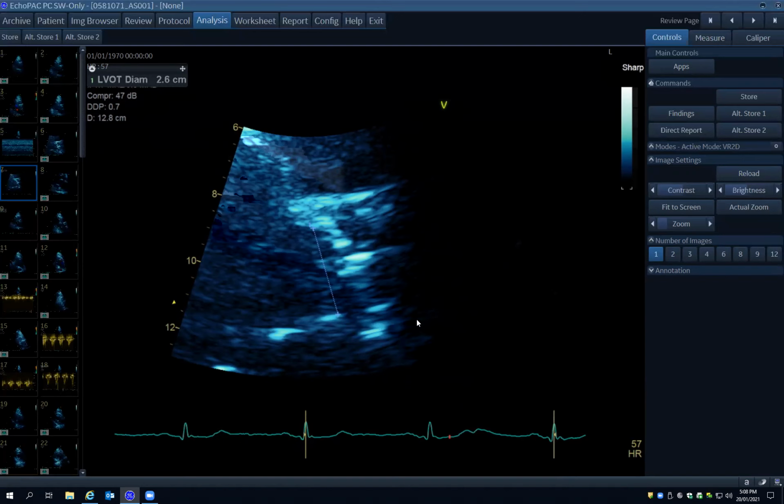Now, if you've got someone that's 6'7", you may have a larger LVOT diameter. If not, then you have to realign to get better views and see if you're extending into where there may be imaging dropout and it might be smaller. Because this was a 76-year-old lady, I think it was, who was not 6'5". So again, my first thought when I saw this was potentially they've overestimated, and then they're going to square that, which has the potential of giving us inaccurate aortic valve areas. And here, what it's going to do is actually underestimate the severity of the potential aortic stenosis.